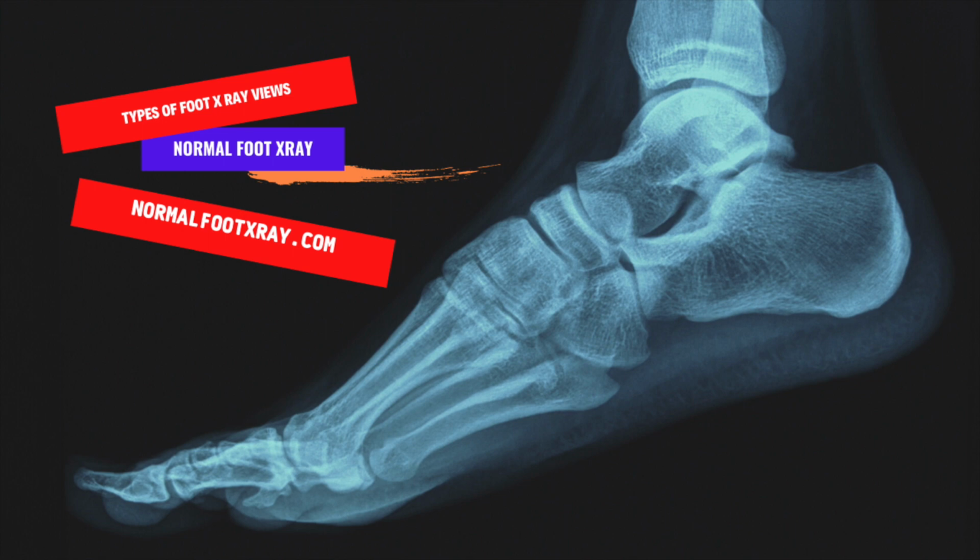Anteroposterior is the more common view, while the lateral is the more detailed view. The oblique and posterior views are the best for analyzing the interphalangeal joints. The lateral and anteroposterior axes are the best places to see the tendons and muscles. A good oblique foot X-ray will show the foot in its natural state.